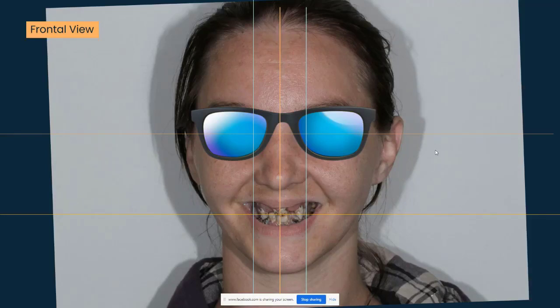And then we also did a facial scan using the Instarisa facial scanner. I think that adds a lot of value if you have it. I wouldn't consider it an essential because I can get to the same position and end result with just the 2D pictures, but perhaps not as consistently and not as easily. And we'll go through that, but the pictures, absolute must.